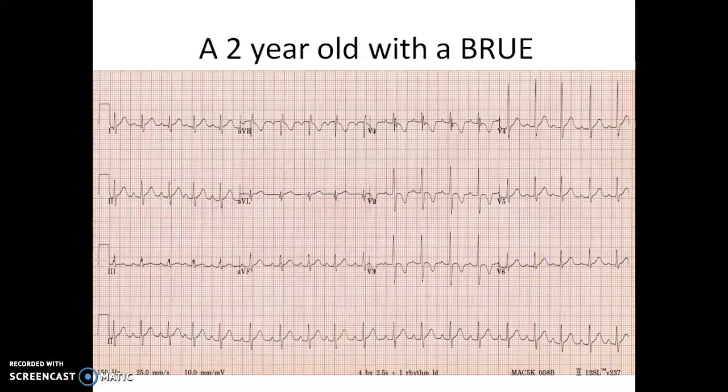So in your groups, we'll look at some ECGs now just to practice that, right? So go through it in the same format, write down the answers, and we'll take 30 seconds to do that.